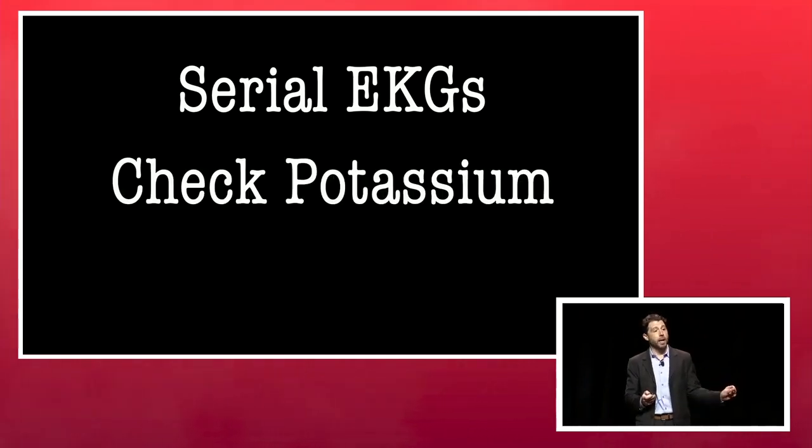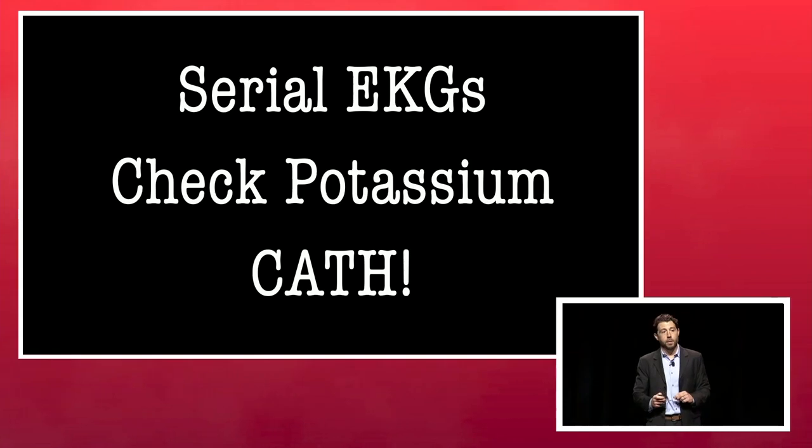This alone is diagnostic. So if you see anything that looks like this, go ahead and get your serial EKGs, get a point of care potassium to rule out hyperkalemia, and do not hesitate to send the patient to the cath lab.